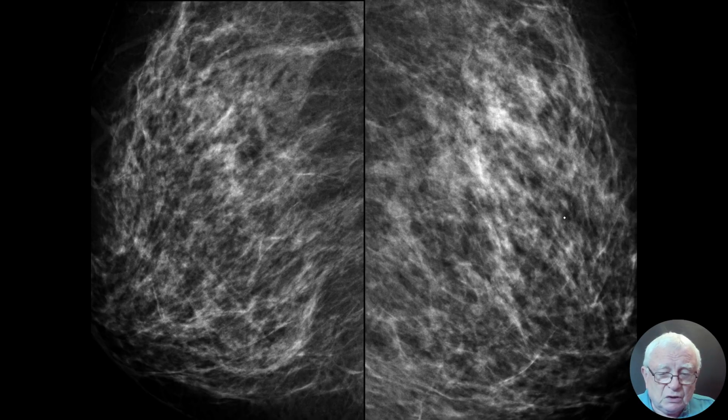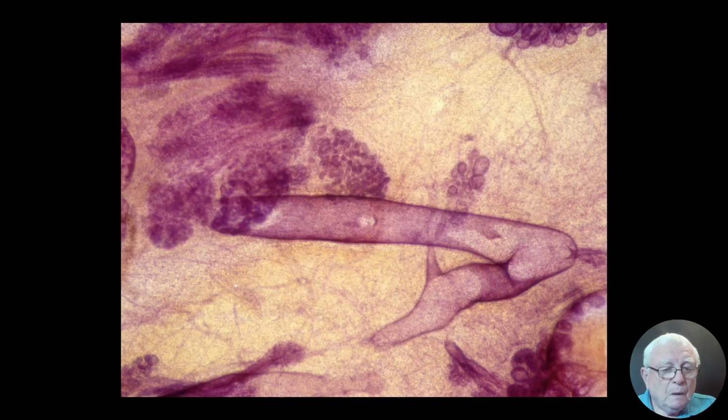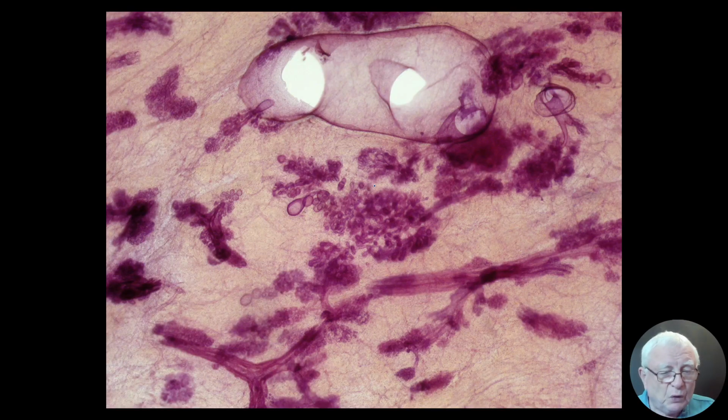Do we see the ducts on the mammogram? Definitely. All of them are pointing toward the nipple. Right? Dear colleagues, when the pleats disappear, then it is very distended. The acini were too busy producing fluid. And that fluid, if it's not milk, then it's because of the apocrine metaplasia. The cells change.